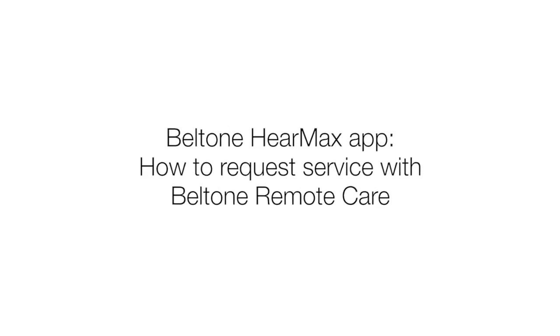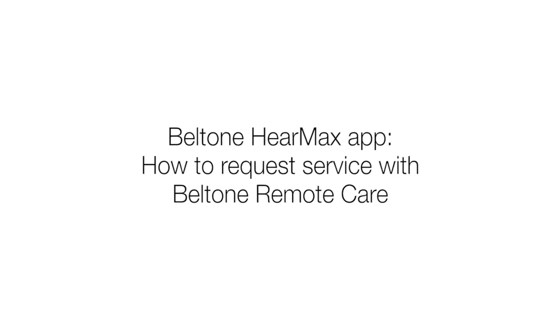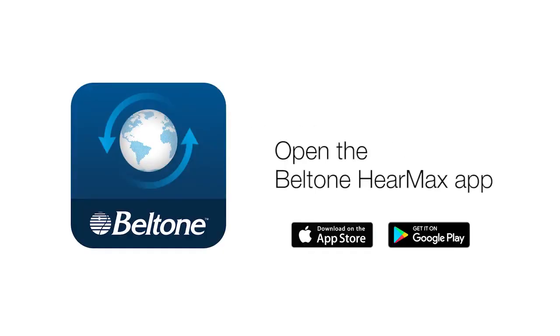Beltone HearMax app: how to request service with Beltone Remote Care. Open the Beltone HearMax app.